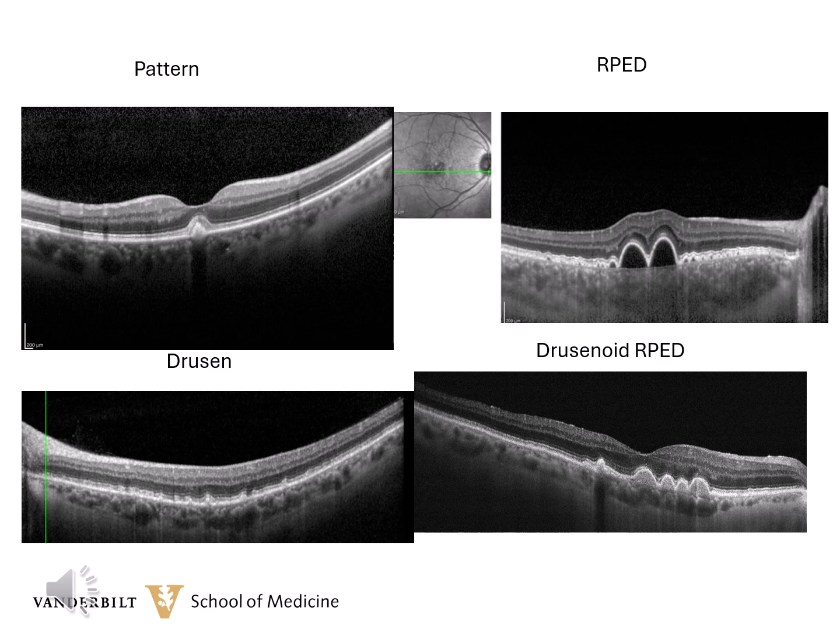So this slide is just to refresh your memory. We've just seen a lot of subfoveal changes from pattern dystrophy. So let's show some of what the differential may look like. So here on the top left is pattern dystrophy with the pathology at the level above the RPE cells. The top right shows multiple pigment epithelial detachments showing the hyporeflective areas, but these areas are under the RPE.